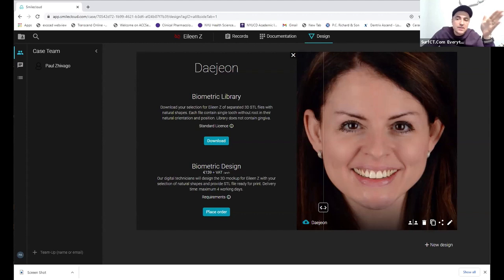what I'm doing at this point in time is I like to design it by myself. So this is also a point of the course that I show you a little bit how. And basically, you now have the possibility to take a screenshot of this. And you take a screenshot of this as well. So you have two screenshots.